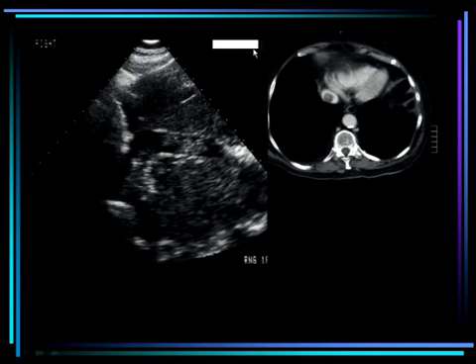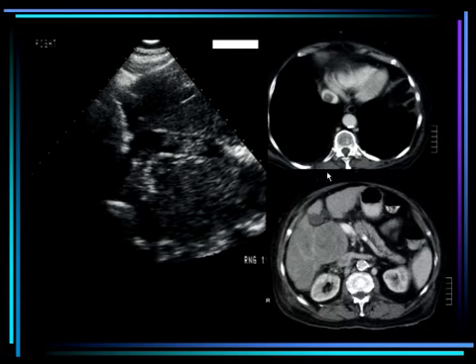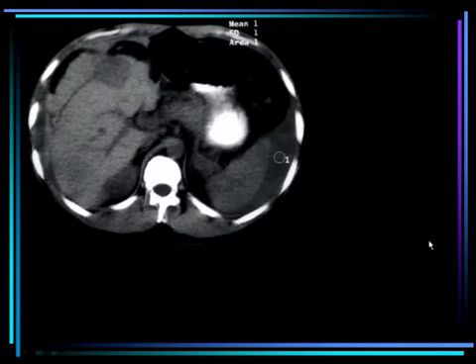This is an example to demonstrate the thrombosis of the inferior vena cava. So you have a thrombus by CT or by sonography, and the reason why you have this thrombus is this large lesion in the right lobe of the liver. Now look at the liver parenchyma. You have inhomogeneous enhancement. You have this kind of anomalous surface of the liver. Everything speaks about underlying cirrhosis. So if you have cirrhosis and you have a lesion, the very first thing that you will say is hepatocellular carcinoma.